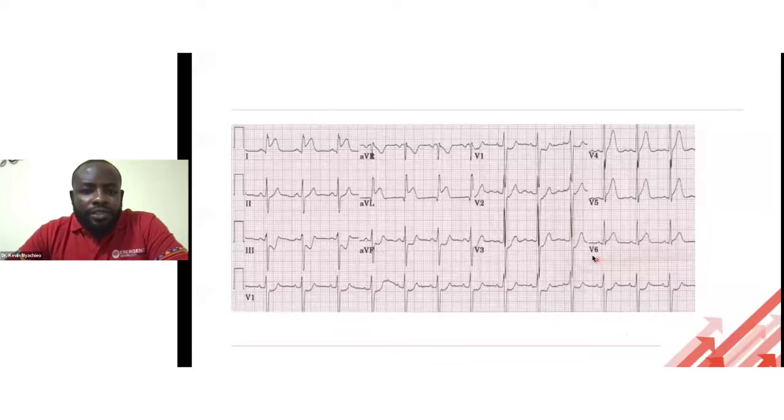Let's change the clinical scenario a bit. 70-year-old female, elder brother died suddenly, no cause was able to be found. Hypertensive, but not really keen on medication. Again, comes in with chest pain. Okay, Eva is saying ST elevation in lateral leads. Lateral leads, yes. Remember, lead 1, AVL, V5, V6. Well, you can see a little, but it's significant in AVL, significant in lead 1, V5, V6, okay?